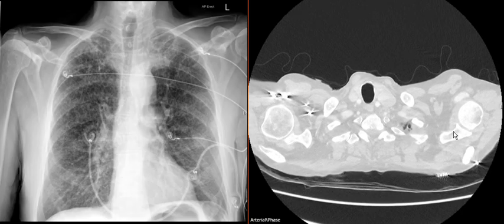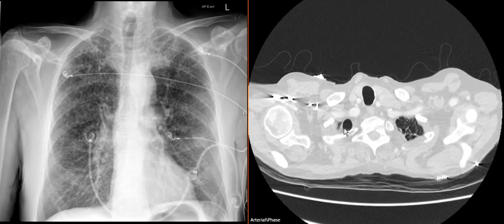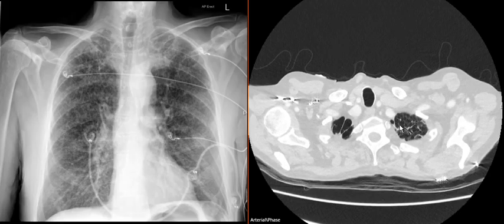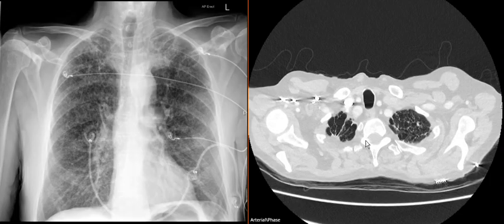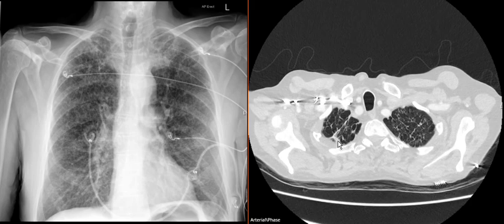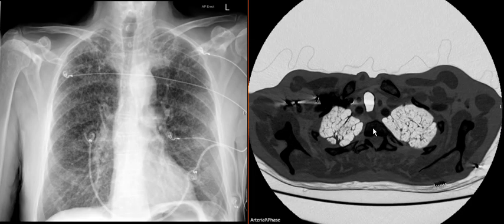And as we roll down, these bits of lung, there should be little wisps of blood vessels and lots of little alveoli in there, but that's just a hole. And this is smaller holes, and the lung tissue has actually been destroyed. These are big bullae. Seems to be a bit of pleural thickening here. But this is what I mean about the structural walls and voids. And again, if we invert that, walls and voids, so not lung tissue, but just big empty space that's lost all the alveoli and lost the elastic recoil.